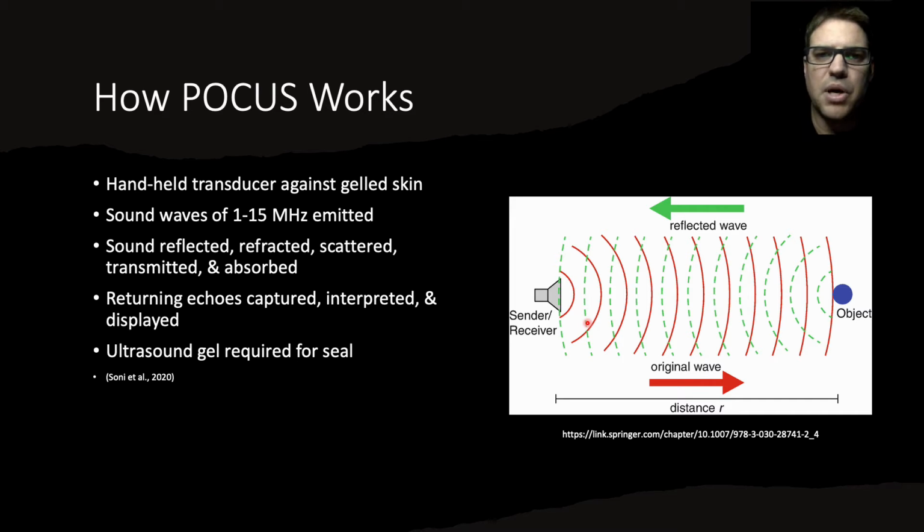on the ultrasound monitor. Because sound scatters at air tissue interfaces, places where air and human tissue meet, like the surface of the skin, a liquid medium, also known as ultrasound gel, is typically required to form a seal between the ultrasound transducer and the patient's body so that sound waves can penetrate the surface.